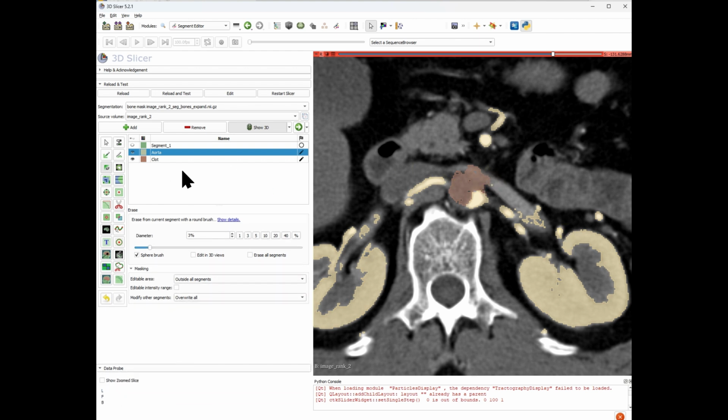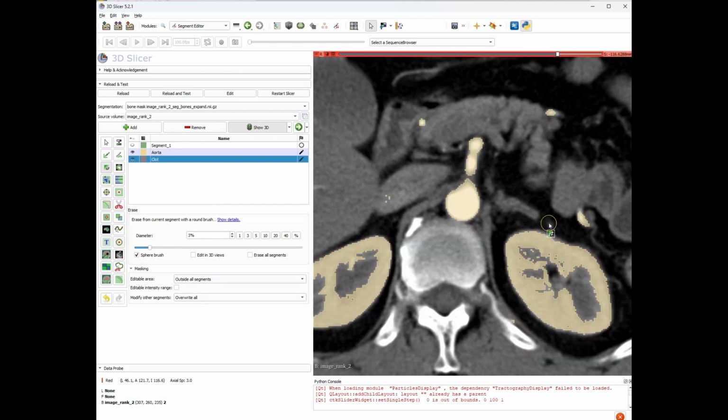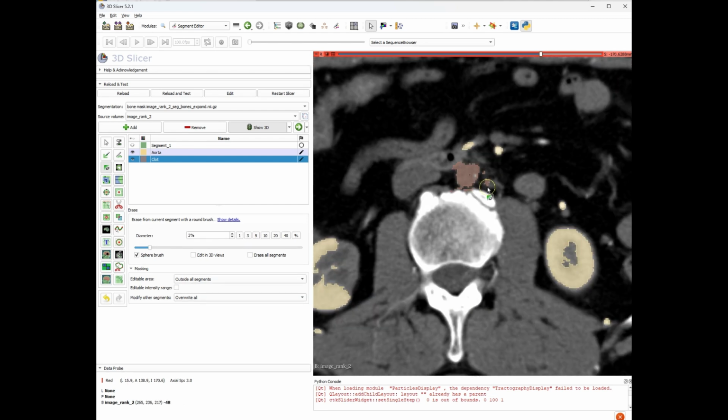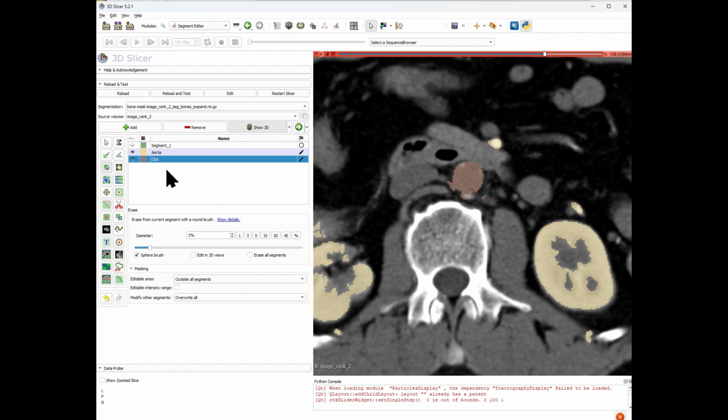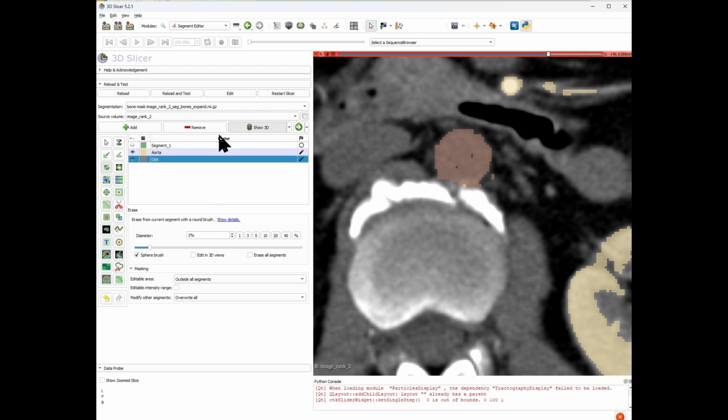If you want to remove the brown, click on the brown, click on the eraser. Okay. So sometimes you want to draw in things, and sometimes you want to erase things. If you see that you still have a missing piece here, you could just go in and draw it in.